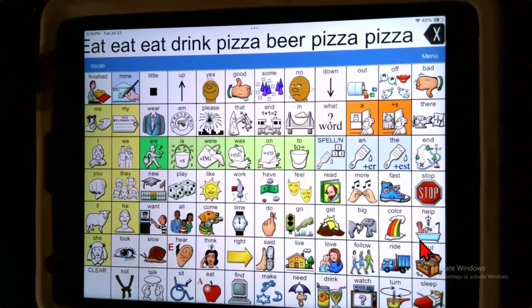Okay, now back to vocabulary builder. I really am a big fan of vocabulary builder. It is one of the most powerful features in the world. It also has probably caused the most harm because you want to use it for short spurts, giving the child the ability to have fun and say what they want to say, and then they have to be back to all their words. But I want to show you that you can save a list of words.